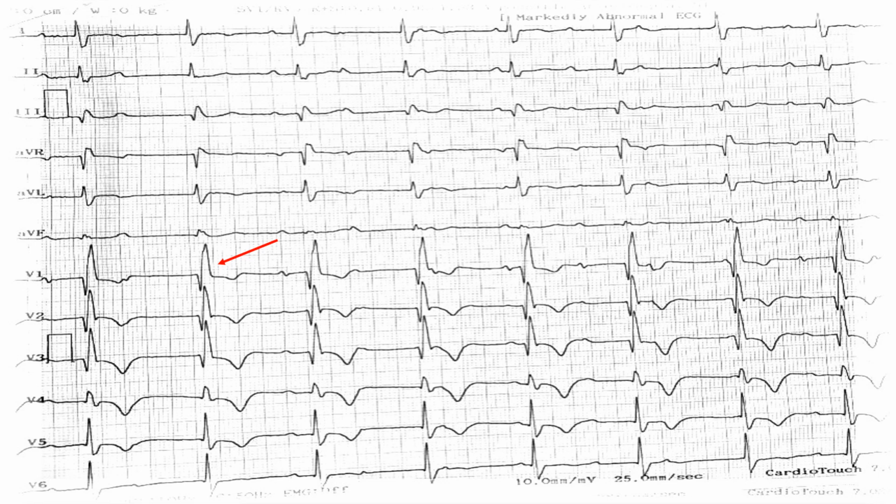Now let's start from the QRS complexes. Well, we can see that these QRS complexes are broad, and that is marked by the arrows. When these complexes are broad, this signifies that he might be having some bundle branch block. There are two types, right bundle branch block or left bundle branch block. So what does this signify? This is suggestive of a right bundle branch block.